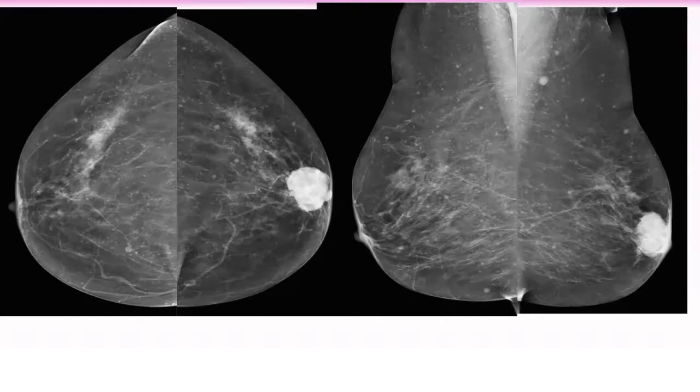No, I told you, within the parenchyma and subcutaneous. So you have to think about something other than neurofibromatosis. It is skin, it is dermal? This is not a dermal lesion. This is parenchymal and subcutaneous. Any suggestion?